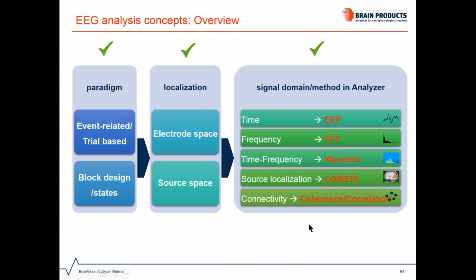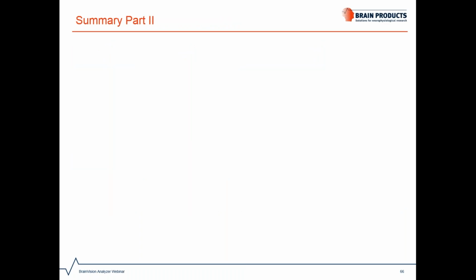And with that, I finish our tour through EEG analysis concepts, and I hope you got a good orientation about which ways you can go. Let me summarize.